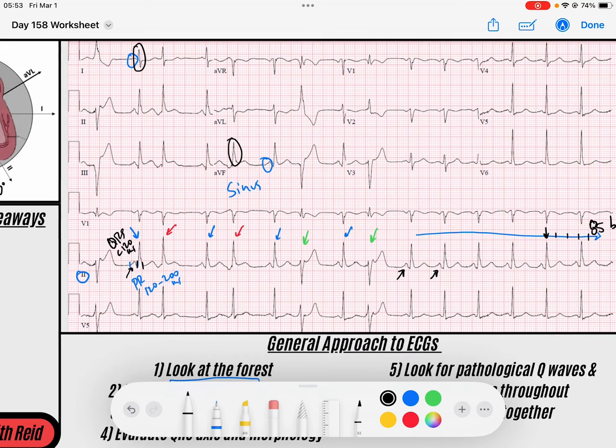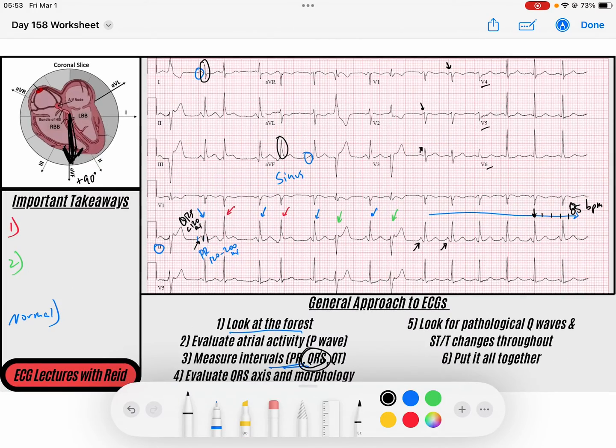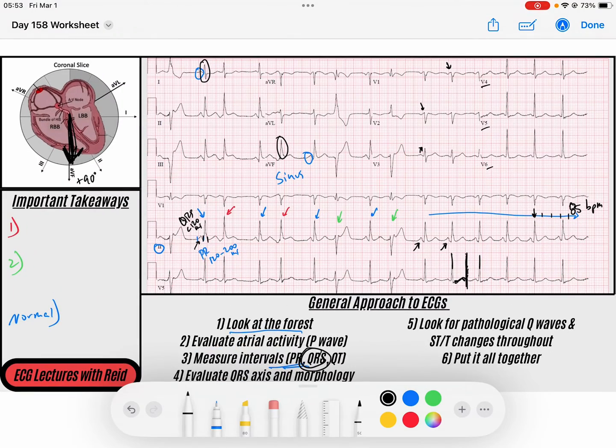And you can see R waves, maybe a little subtle R wave, if any, in V1. It slowly grows to something more positive in V3, and V4, 5, and 6 look good from an R wave progression standpoint. Okay. And so then we look at our QT intervals, and QTs look okay, right? If you find R, midway point right here, you can see that T wave is pretty much done by then. So QT interval looks okay.